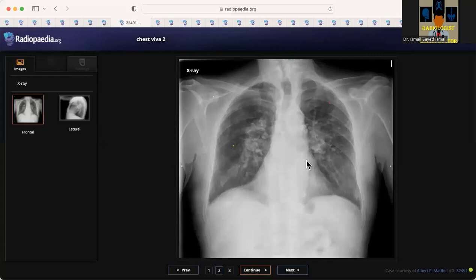Regarding silicosis, there are innumerable nodules in the upper lung field and calcification is more common in silicosis than sarcoidosis. Silicosis doesn't have the 1-2-3 sign of sarcoidosis, no paratracheal lymph node here. Yes, that's right. So TB? It's mostly asymmetric hilar lymph nodes, and may have other parenchymal changes. Yeah, that's right.